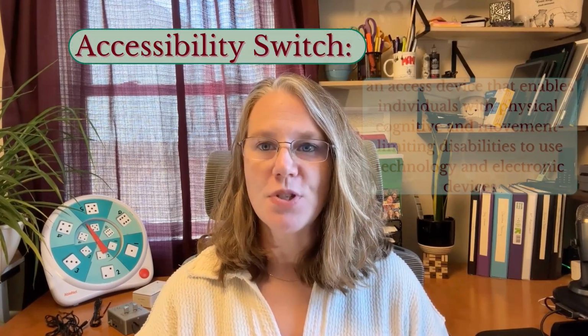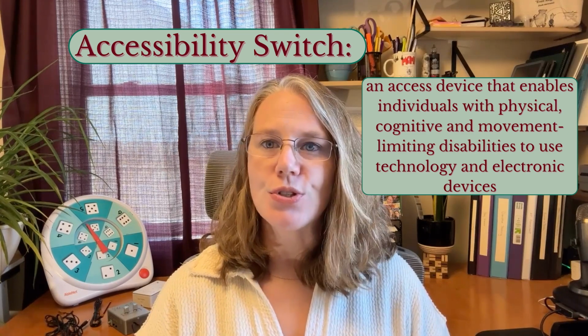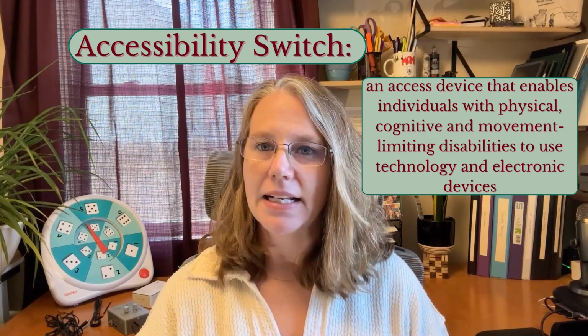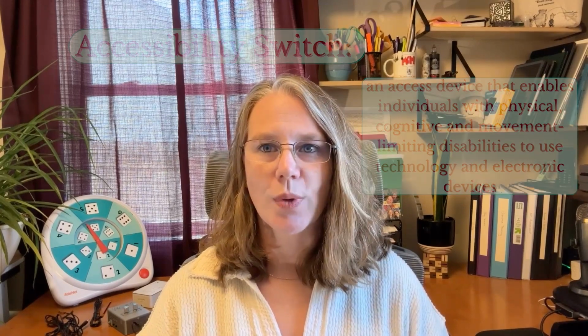Welcome back. Today we are going to talk about accessibility switches. Accessibility switches are different types of buttons or other shaped switches that allow a user to turn something on or off or to change some sort of setting on a device by activating the switch.